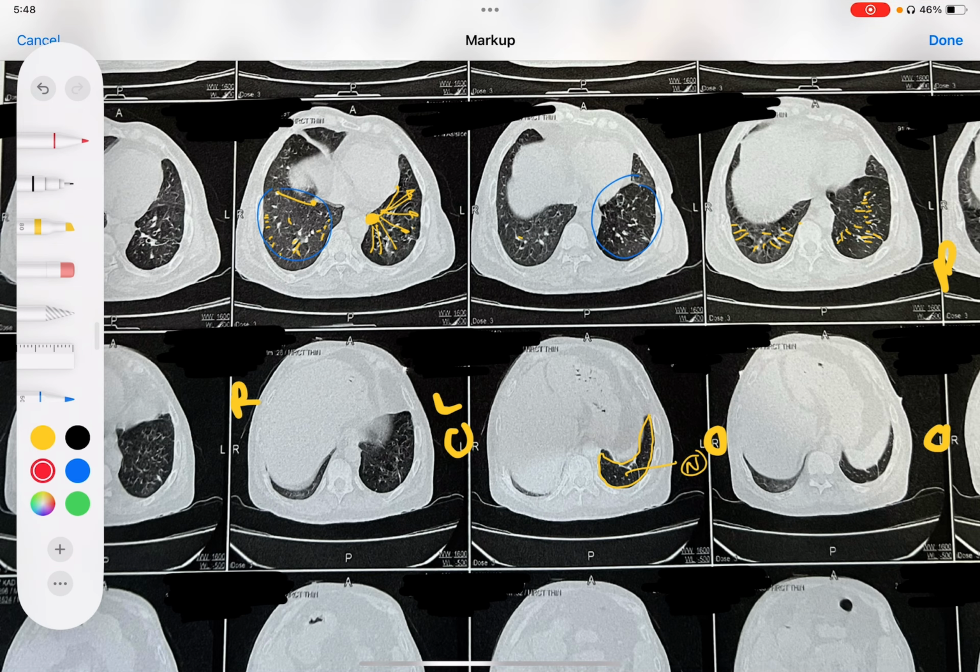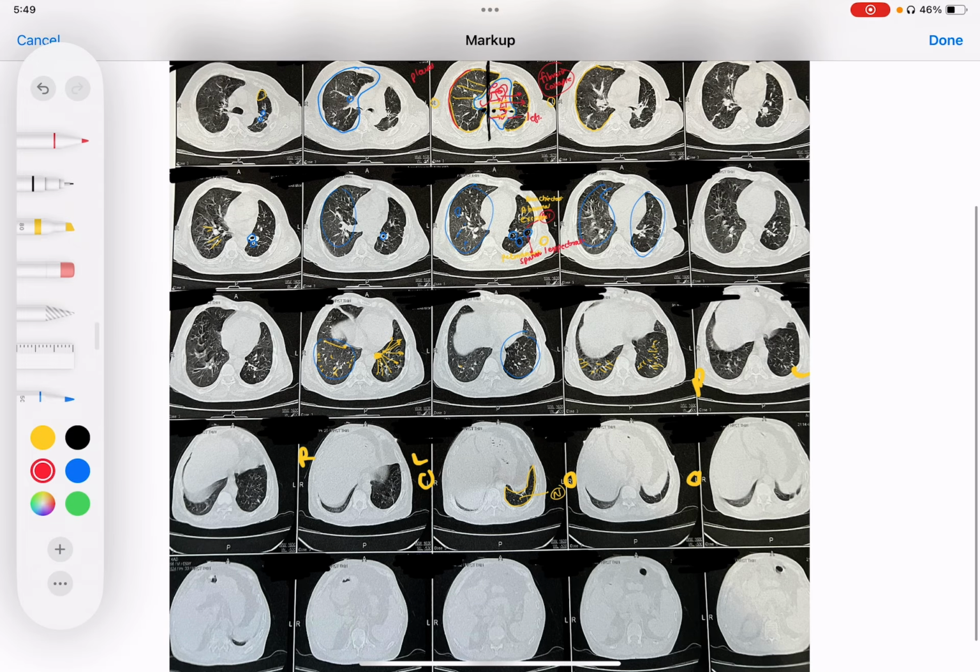So this is one of the very interesting HRCTs of the chest, showing bilateral lung parenchyma involvement, extensive bilateral restrictive lung disease, severe left-sided restrictive lung disease with fibrosis, collapse, and mediastinal shifting as well as tracheal shifting, along with few patches of bronchiectasis as well. And that was in a patient who was immunocompromised and with a history of tuberculosis in the past. So this is for all, and thanks for your kind listening.